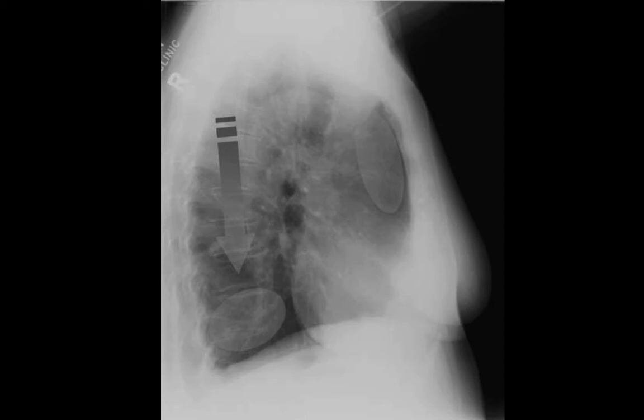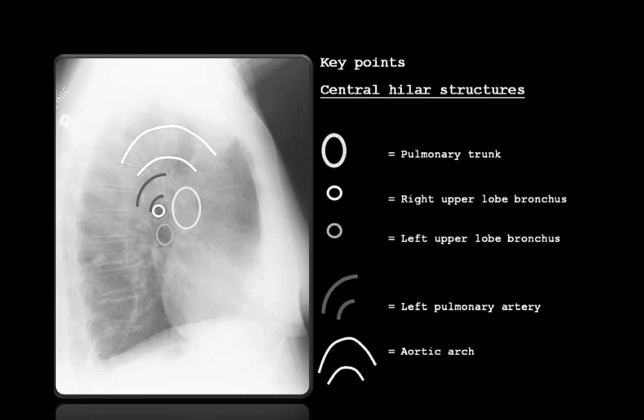So never say, viewing a normal x-ray, that the chest is normal. I should recommend that almost always there should be a lateral view if you really want to evaluate the lung and chest properly, if you don't have the facility for CT scan.